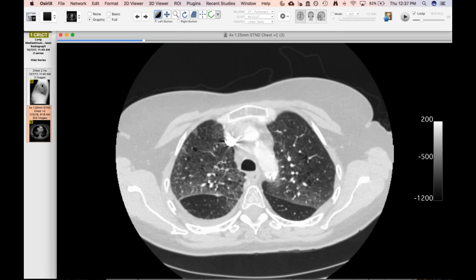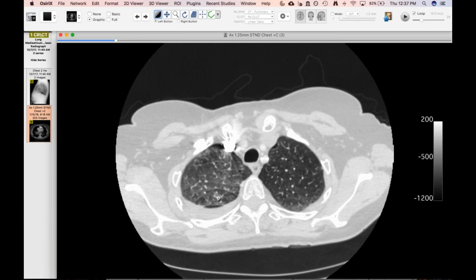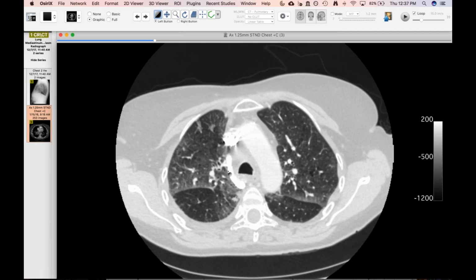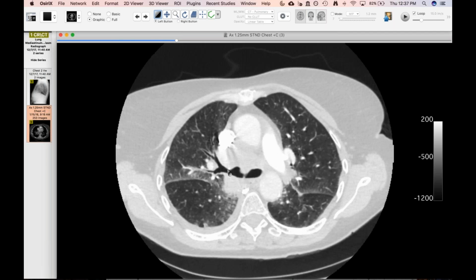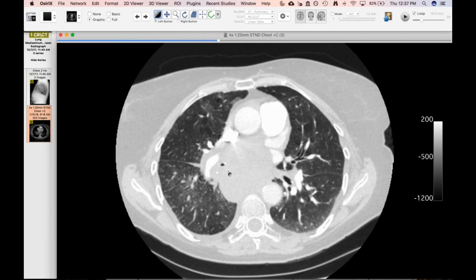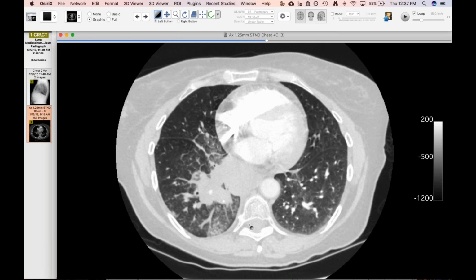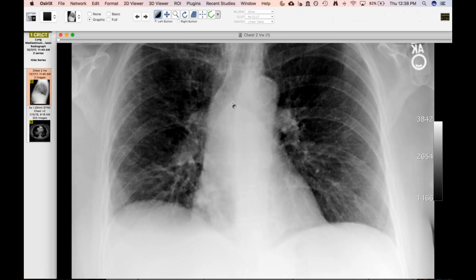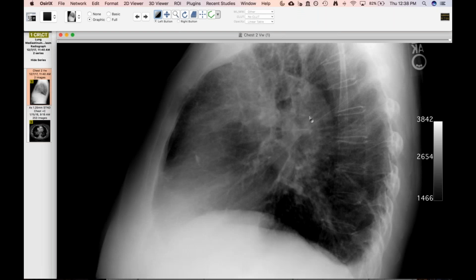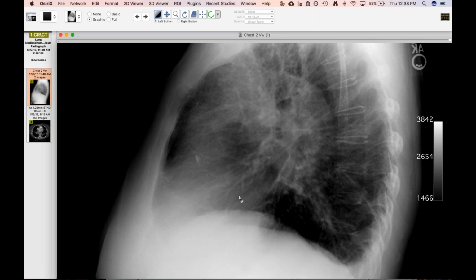And I think probably what they were seeing on the original radiograph is what we see here, which is likely a combination of venous and lymphatic obstruction just from this huge tumor taking out the right superior pulmonary vein. So this was small cell. You can see it's extending into the right lower lobe at this point too, but pretty scary mass that, if you're not attuned to looking at the mediastinum, I think the lateral is easier to see it even than the PA view, that it can be easily missed.